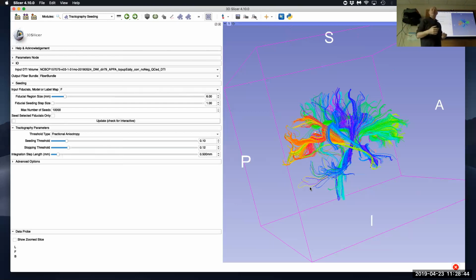Yeah. I was just wondering, what's currently the standard? Do you do a full brain tractography and then label each file? Just the way I did it right now. You just do 5 or 6 fiducials, because this is only for QC purposes. It's a throwaway tractography. Okay, no, I mean for analyzing these. If you want to analyze a certain fiber bundle, do you generate them separately and then analyze them, or just generate the full tractography and then label, and then analyze?